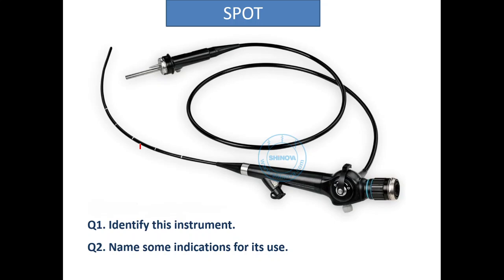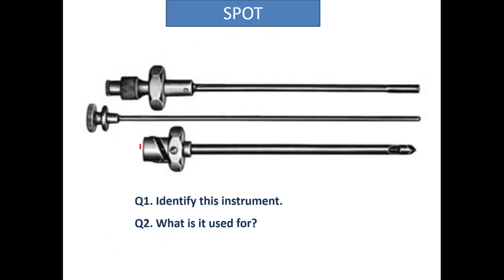What is this instrument? Name some indications for its use. I'm giving a gap of 10 seconds. Look at the instrument. Did you make the diagnosis? Diagnosis? Bronchoscopy. Indications? What are the indications of bronchoscopy? You can make it out.